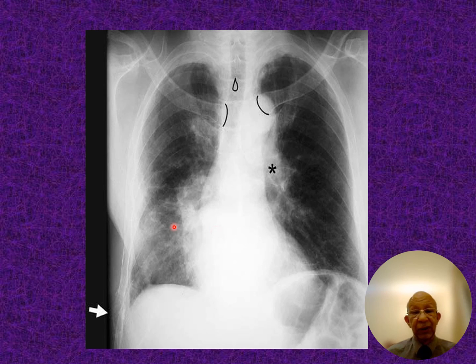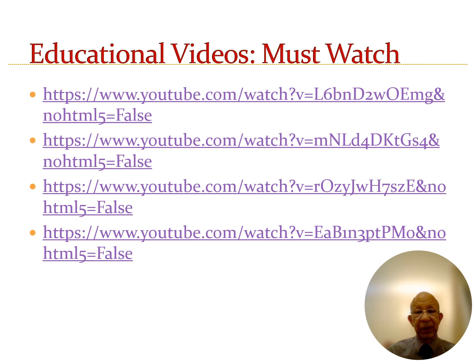This is an X-ray. You can see there is abnormality. There are abnormalities in this area on the right side, right? But the interesting finding is that the ribs here, if you don't look at the bones, you might miss it, right? So the ribs are eaten. So this is suggestive of a pathology there. It's actually a metastasis, a rib metastasis, right?